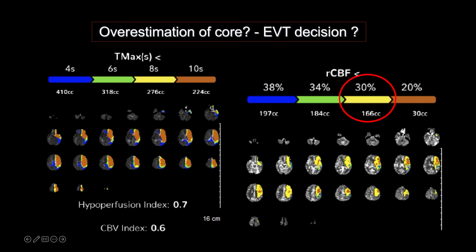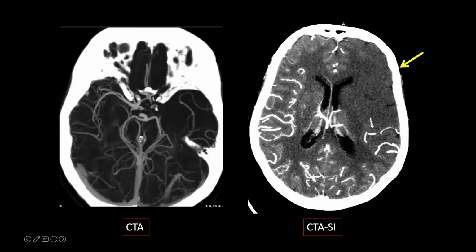This is really important to know that sometimes if these thresholds are moving this fast, you have to be careful. And that's where, again, you can have a conversation with your stroke team, with your interventional team, and of course, very importantly, with the patient and family. So this was the CTA, left MCA occlusion, and then you have the CTA source images, again, showing an area of really poor collateral. So just looking at this, we know that this has got poor chances of survival.